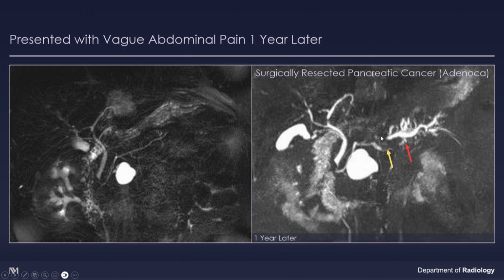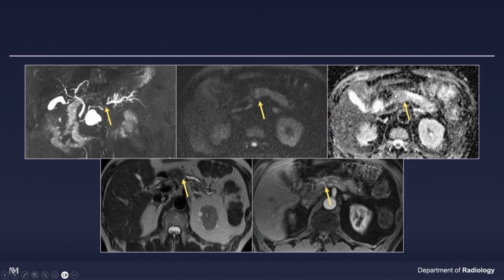Fletcher, where they reported anywhere from 6 months to a year and a half before the diagnosis of pancreatic cancer, you can often see features suggestive of cancer, including this abrupt terminating duct sign. So anyway, he had the MR, and if you look closely, you might suggest a mass. There's certainly features suspicious for a mass, but more importantly, he got the EUS, got the biopsy, got it resected, and as I mentioned, he's already alive 10 years later.